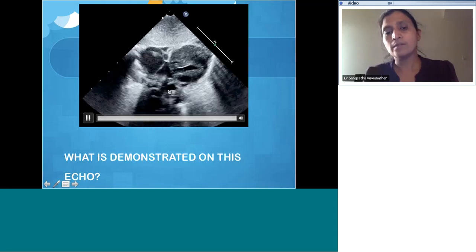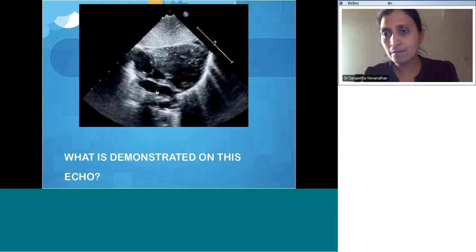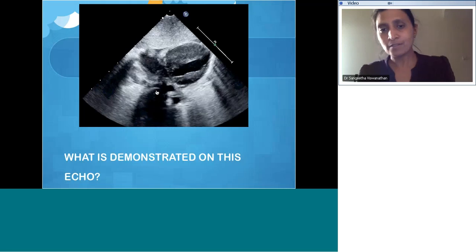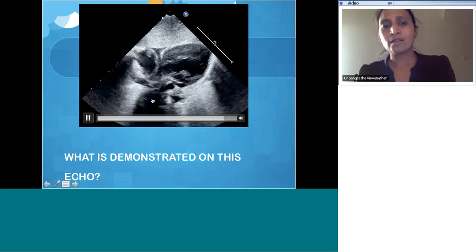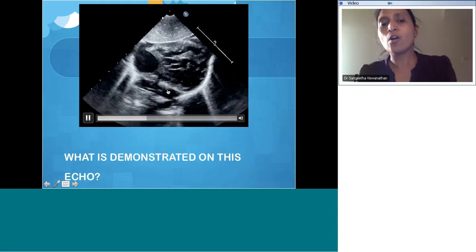What is this? Come on, guys. Same patient. Correct. So this is a common chamber or confluence.